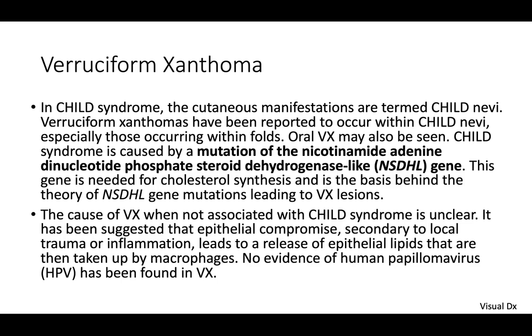And so they're going to come in, they're going to proliferate, and they're going to cause a reaction to the overlying epidermis that is very characteristic of a verruciform xanthoma. So this is a xanthoma at the heart of it, but it takes on a verruciform appearance. It's not completely understood exactly how the NSDHL gene mutation leads to the architectural changes in a verruciform xanthoma.